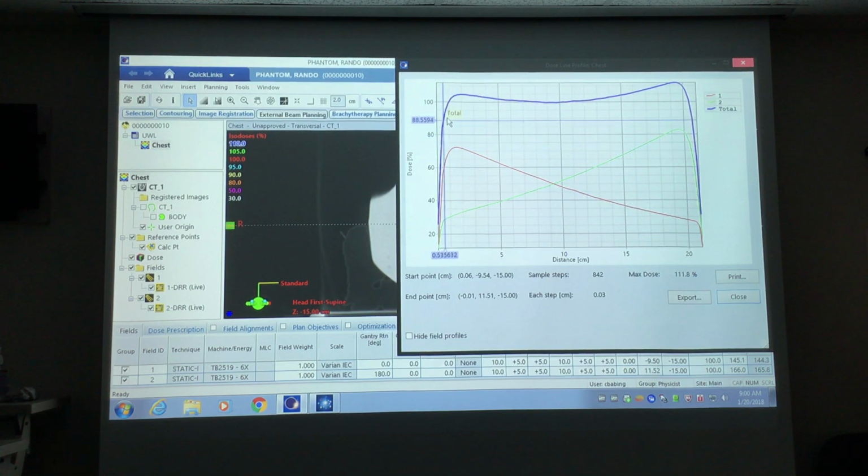The blue is what helps us understand where the hourglass shape comes from in the isodose distribution. The percent depth dose from field 1 and the percent depth dose from field 2 are added together, and they give us the total dose, which is blue. And we get Dmax, and then we get some fall off, but it doesn't fall off as much as one field because we have contribution from the opposing field. And then we come back and go to Dmax on the other side. So this is why the hourglass shape occurs for an AP-PA, or a parallel opposed field arrangement.